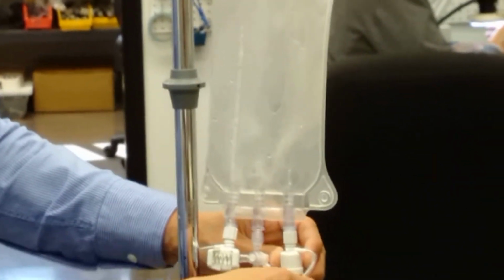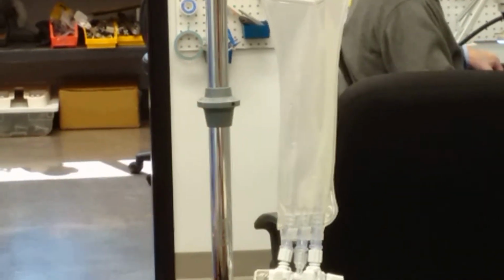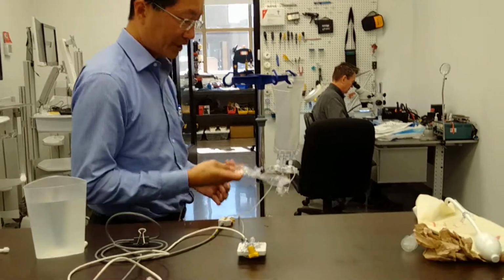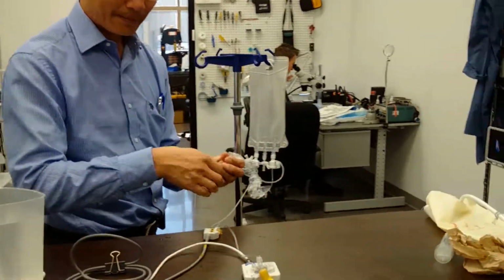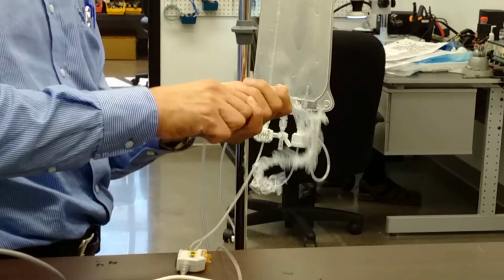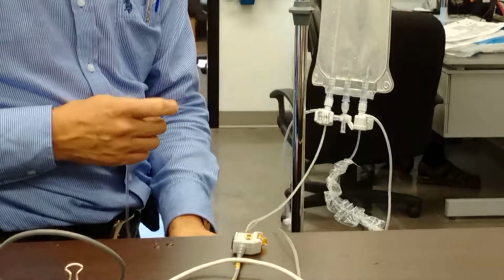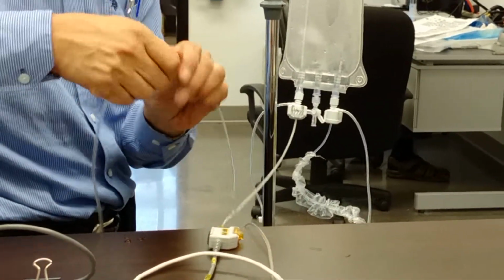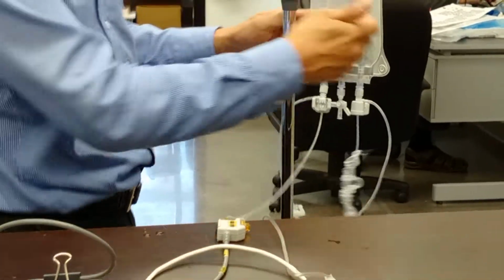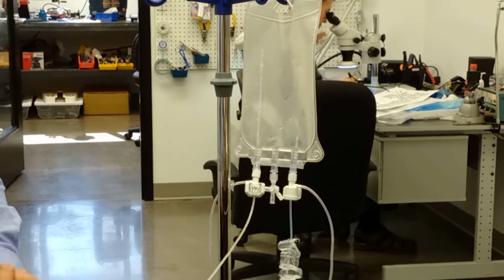Or like in the previous video, we would combine the air and water into one, and then we will move its location until we have the same readings. I can do that right now. I can take this off. I can redirect the water pressure measurement to here. So once again, disregard the water on the right. We just are dealing with the air catheter on the left.